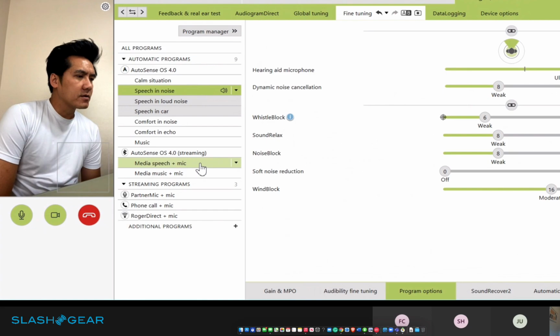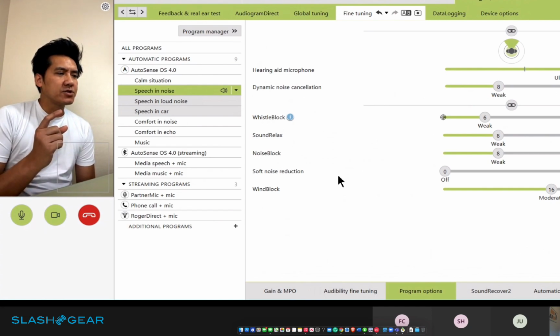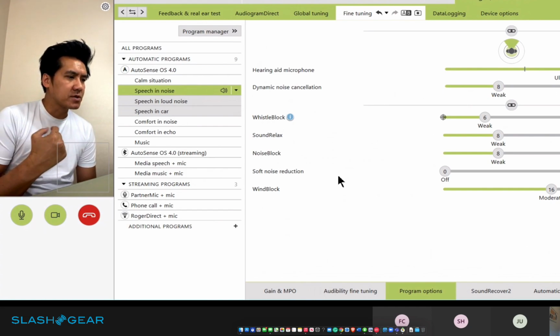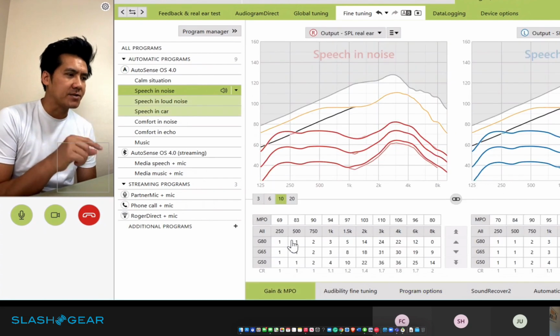I think I'm good. What about the mic when I'm not just streaming, but using phone calls? Can I see the profile for phone calls as well? Because I use these for phone calls quite a bit. If you can explain to me how that profile is set up.